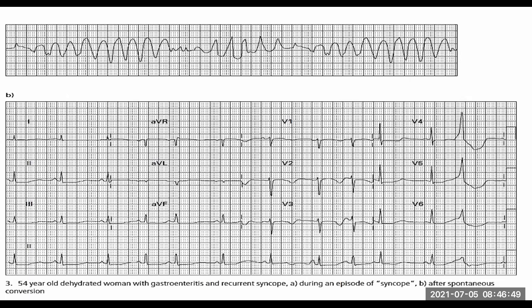All right. So even when you look at the algorithm for tachycardias, ventricular tachycardias, it divides them into two types, monomorphic and polymorphic. Monomorphic, in other words, would mean that the ventricular tachycardia, everything looks exactly the same. Is that what we have here? This is actually a polymorphic ventricular tachycardia. So now you're really searching for Dr. Mohammed's number at 2 in the morning. So you've tried everything, it's not really working. But you actually gave us the answer, which we're going to go to just now.